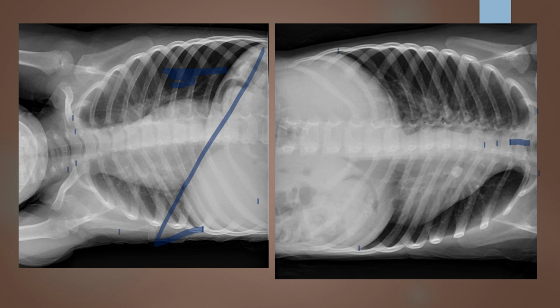Now we can look at our mid-sagittal plane, which is going to follow that mid-coronal plane rotation. Now we're going to look at our mid-coronal tilt. In this case, it's kind of like having a supine patient. They're going to probably have a little bit of mid-coronal tilt just because of positional factors. But I'm usually going to evaluate my mid-coronal tilt by seeing if the manubrium is over T4, and this manubrium happens to be over T1, T2, and 3.